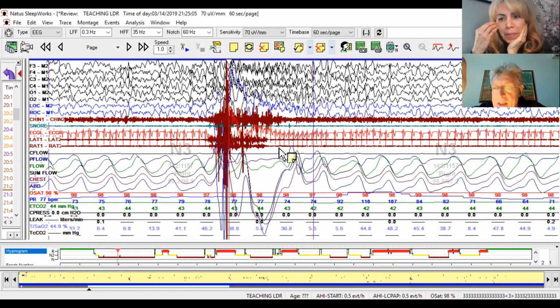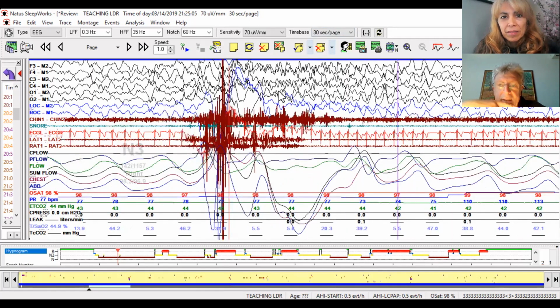Now, how many seconds do we have here? This is 60 seconds. Okay, can you put on the 30 seconds, please? Because I will show you the difference. Okay, now you can detect much better the starting point and the ending point.